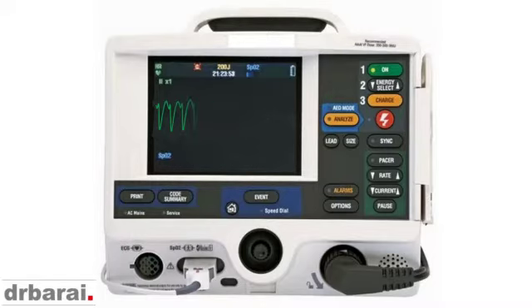As you can see, the QRS complexes are very wide, regular, and very fast. These are all the classic presentation of VT. There are maybe some other differential diagnoses. For example, it can be hyperkalemia. It can be an SVT with aberrant conduction. It can be a sodium channel blocking drug.